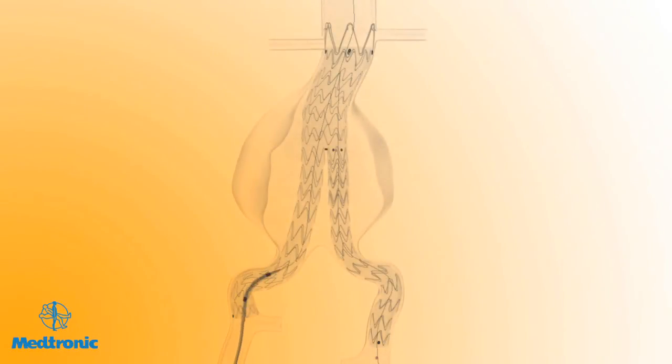The Reliant stent graft balloon catheter, packaged separately, may be used to remove wrinkles and folds from the graft material as needed and to model the stent graft to the vessel wall. After consulting Reliant's instructions for use, advance the Reliant balloon over the guide wire to the target location. Next, inflate the Reliant balloon with contrast solution and model the stent graft to the vessel wall.